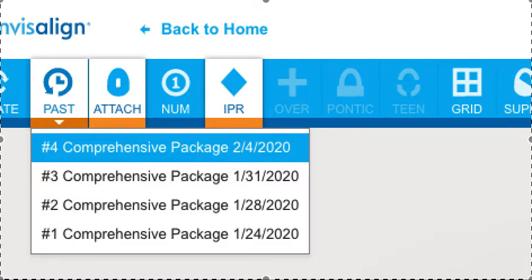35-year-old female, 6 millimeters of crowding, 3 options as far as I can see. And every patient always has options. And if you're not giving your patient options, you're not doing good ortho. And that's really because part of doing ortho is doing ortho standard of care, like an orthodontist. And an orthodontist will give their patients options, almost always. It's very rare that you don't have options.